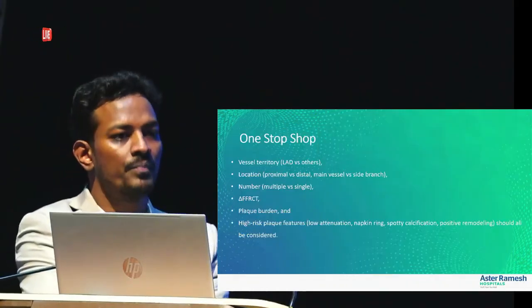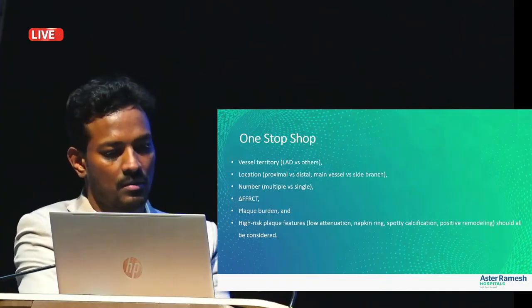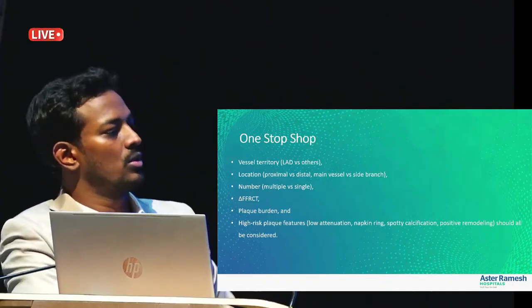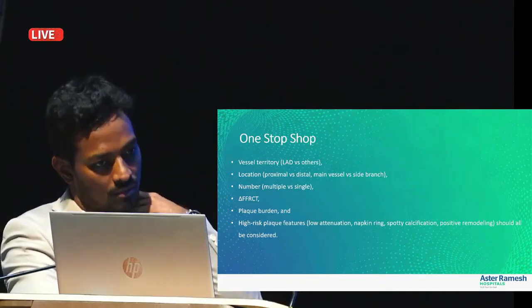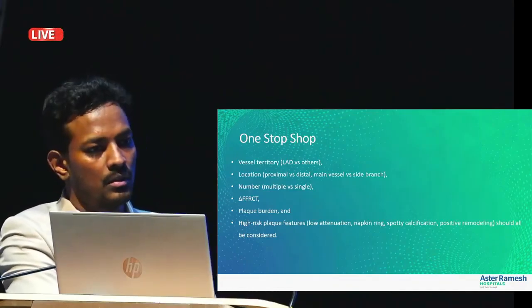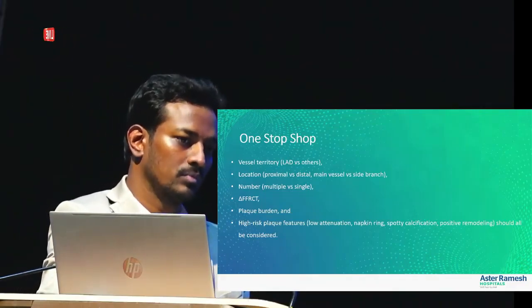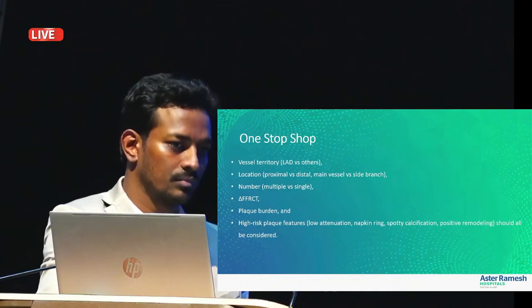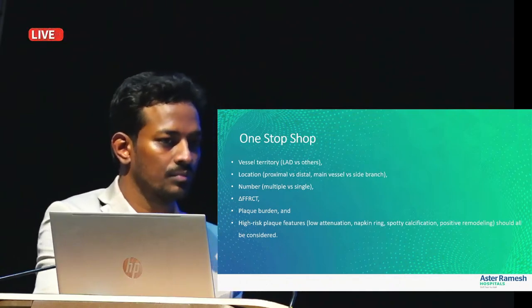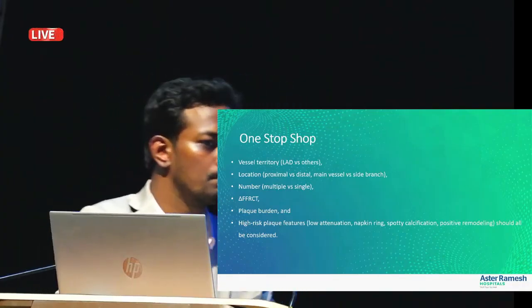Nobody would expect a thrombus in LCX looking at this angio. So surprises are also seen sometimes when you're looking at a combination of things, both the FFR and imaging nowadays. Though you have to be selective, in proximal vessels we should not think twice before ruling out anything, because the patient can land up with LCX complete occlusion. There could be some erosion or rupture, which is responsible for the thrombus, and she may land up with inferior MI. So this has helped us.